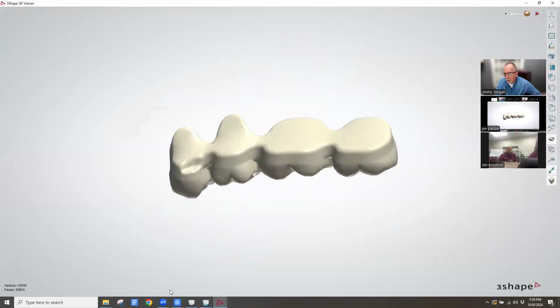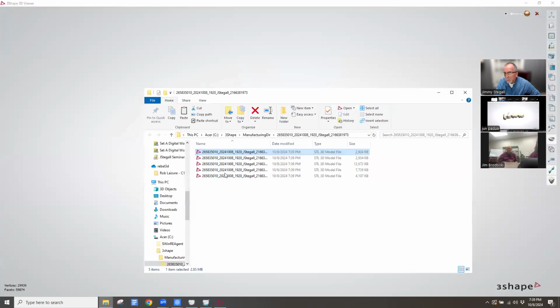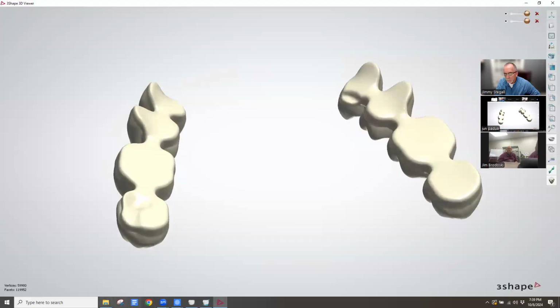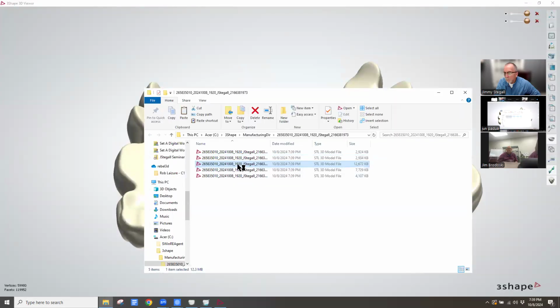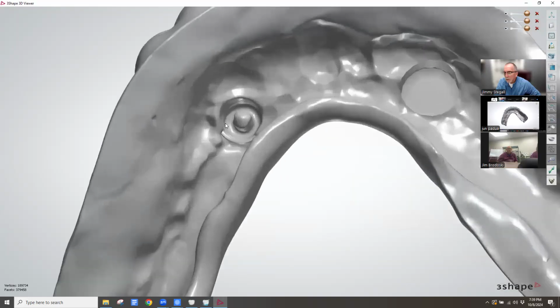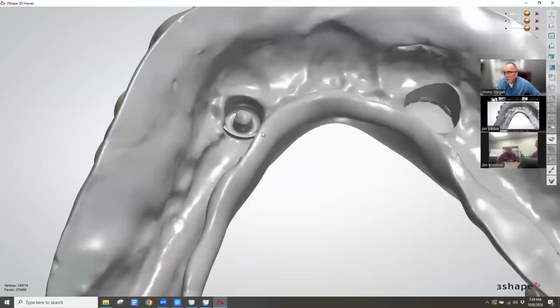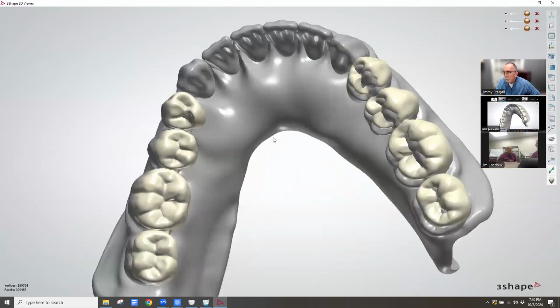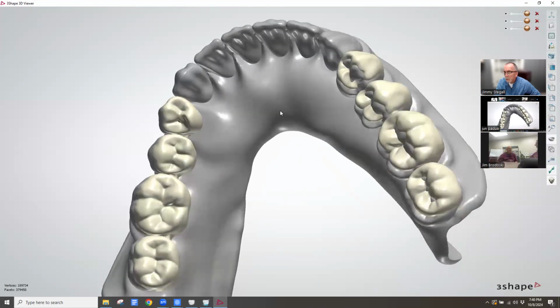Cut back to that attachment. So yeah, you see how the attachment lifts the little nib that I'm going to have to cut down, but it did create the space. And the monolithic version is there.